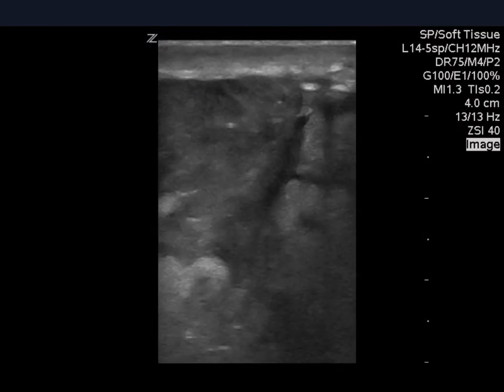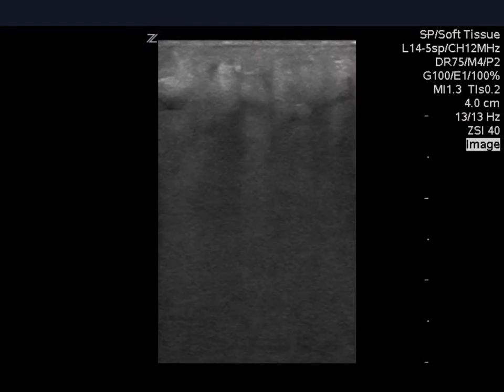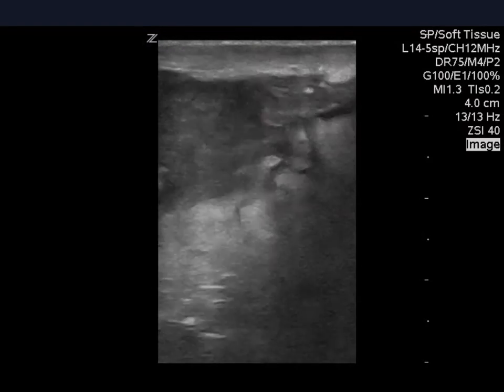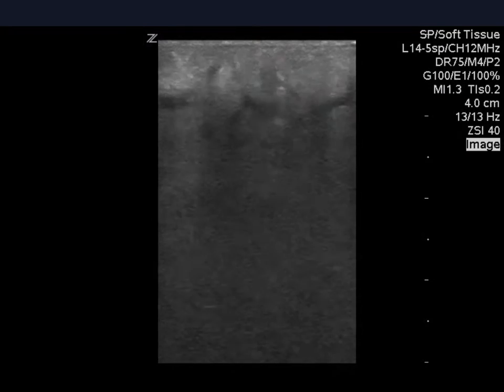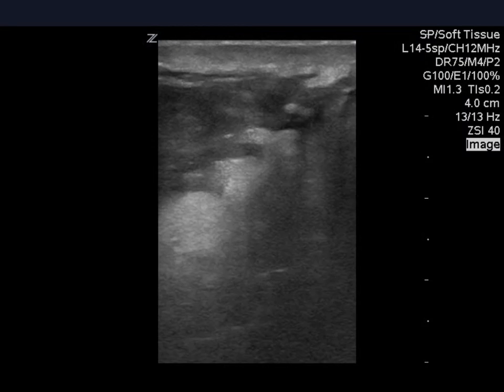Also, you might note to the right side of the screen that the tissue surrounding the area of interest seems to have fluid within it, giving the typical cobblestone appearance. Now, is this enough to say that it's safe to poke? No, you guys are smart.